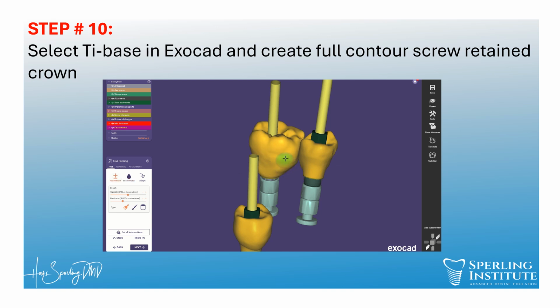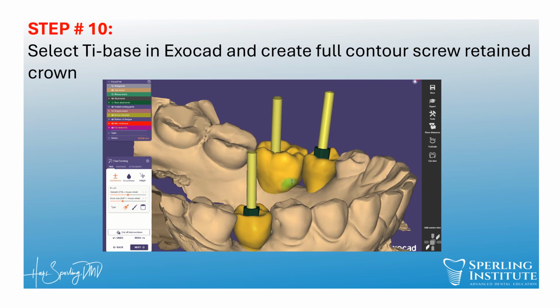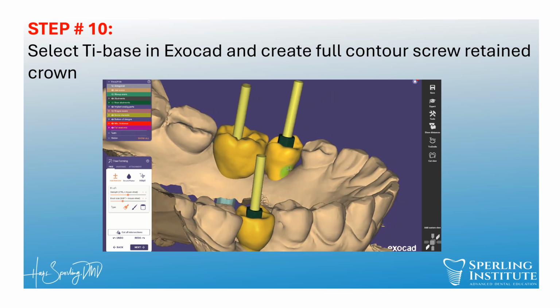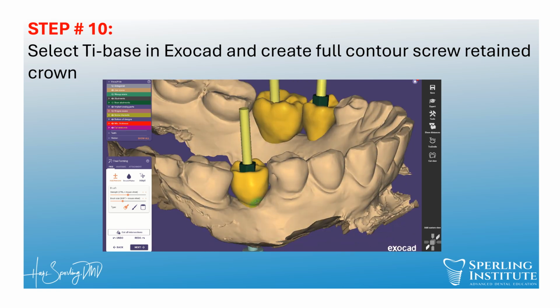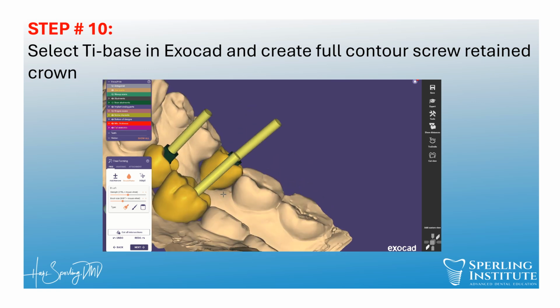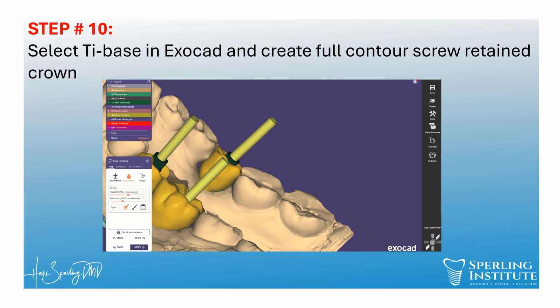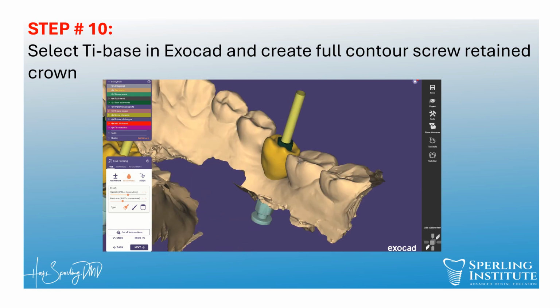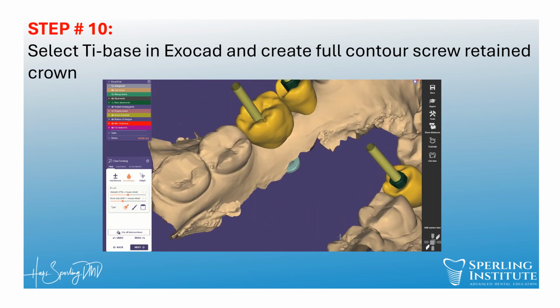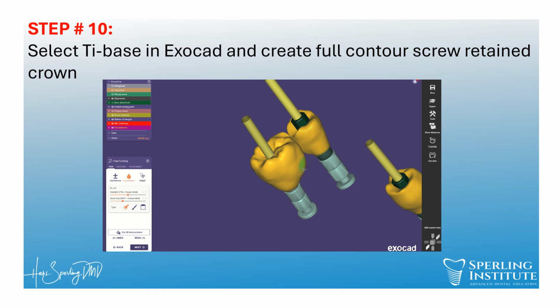I'm deficient in this part here. And you can spend infinite amounts of time on these parts, right? Up to you how much time you want to spend.